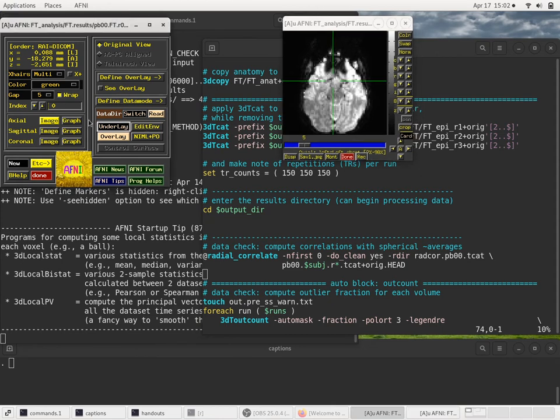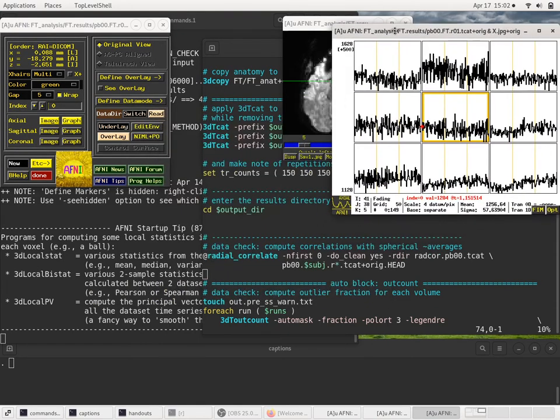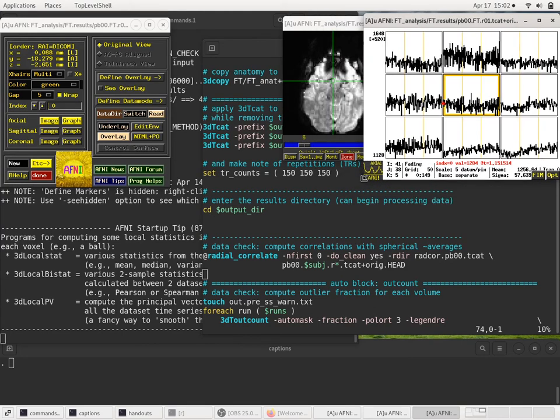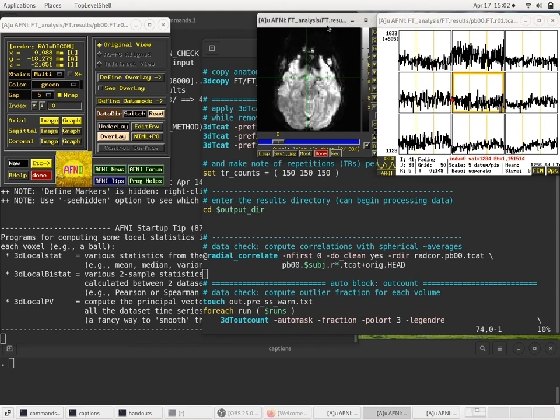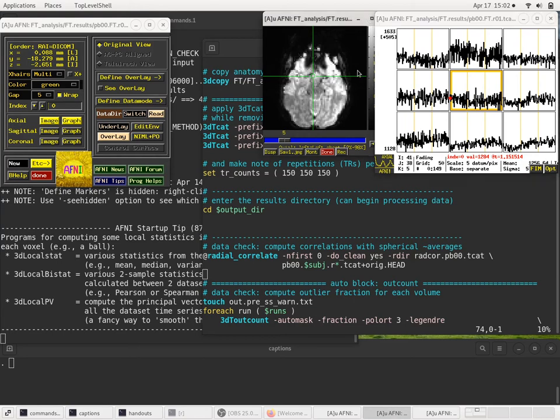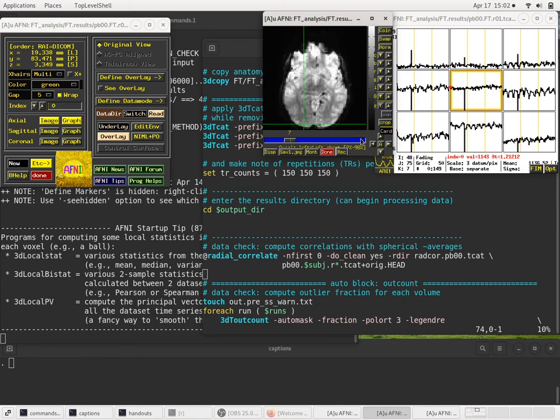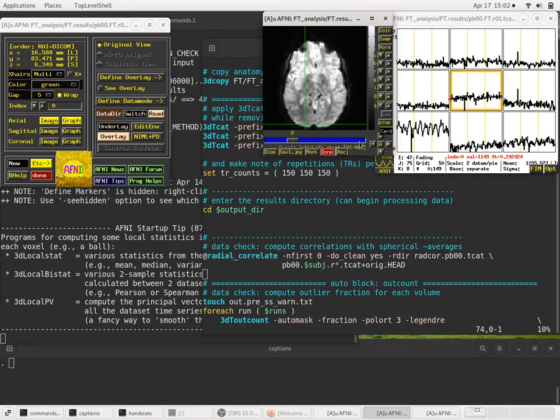So fantastic. And I'll open a graph window as well. Here's a graph window, and I'll make that a little smaller. Hopefully this might get a little tight here. I've lowered the resolution of my recording. I may pay the price for that. We'll see. Anyway, now let's go find some time series that looks reasonable, and then we can use that for navigation to keep us all in the same place. So we're seeing some good voxels down here. Maybe I'll go a little more superior.